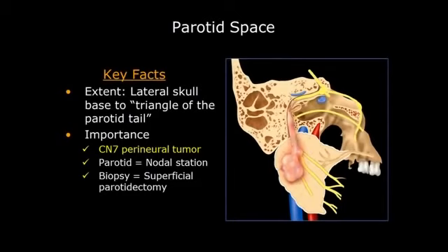Fortunately, it doesn't go directly intracranial. It has to go all the way through the temporal bone. So often, even if we miss it, we catch it later as it's headed up through the stylomastoid foramen and up the mastoid segment of the facial nerve. We've all seen them go all the way into the CP angle, especially the low-grade ones where they're not symptomatic until very late.